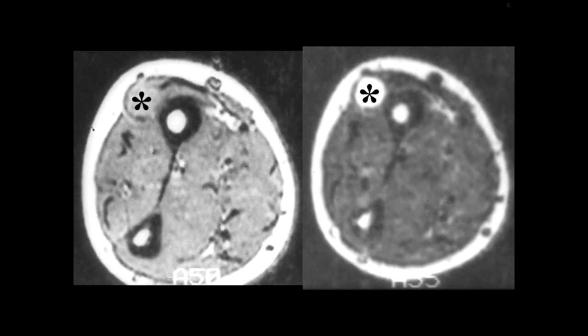Okay. Now, what do you do about cases like this? Well, this is tough. This was a 9-year-old. He came in, his parents noted that he had this little mass in his forearm and had been there for about 5 months of observation. It started out like a small chickpea size and grew to the size of a walnut, but it didn't hurt, but it was growing. And they were very right to bring it in.